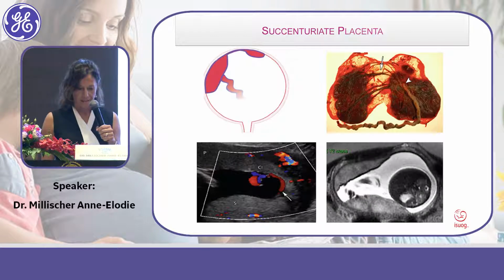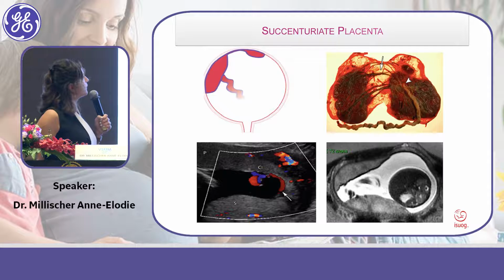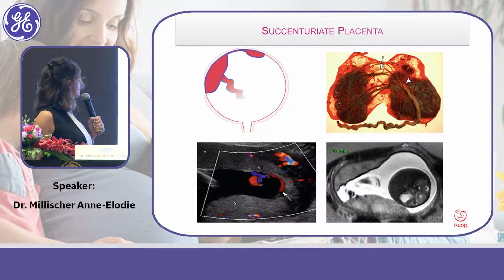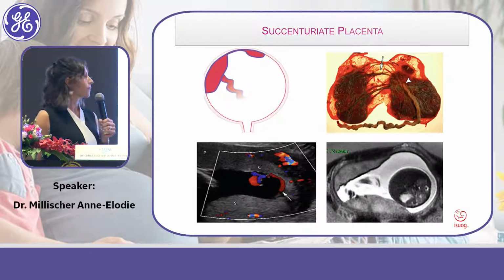Theo cái hệ thống đó, mình đầu tiên sẽ đi vào đánh giá cái hình dạng của bánh nhau và cái đặc điểm, cái biến thể đầu tiên của bánh nhau tôi muốn khảo sát đó là bánh nhau phụ. The definition of this kind of placenta is the presence of two lobes, as you can see here, with vessels going through the two parts of this placenta. Trong cái bánh nhau phụ này mình sẽ thấy bánh nhau nó có hai thùy, một thùy lớn và một thùy nhỏ, và cái mạch máu nó sẽ chạy ngang qua cái giao diện giữa hai cái thùy này.